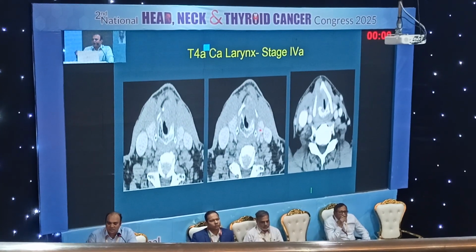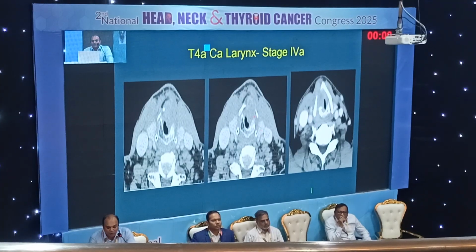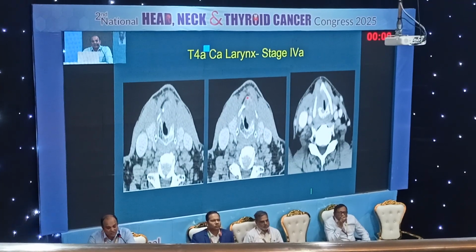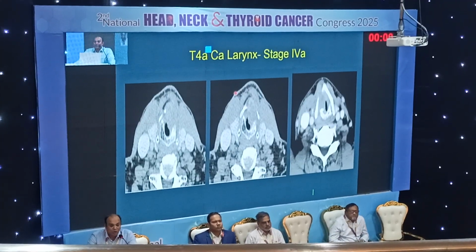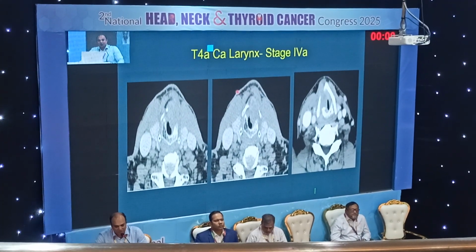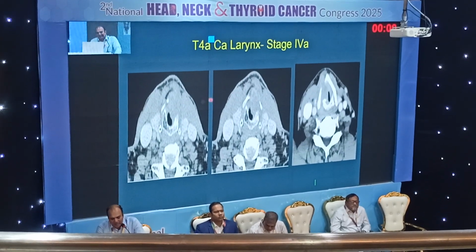Whether you need to address the thyroid gland surgically also, that's also very important. So the other thing we have to look at as surgeons is the extent of the soft tissue in the anterior aspect, because of how you are going to reconstruct. And these are all concerns when you look into the CT scans.